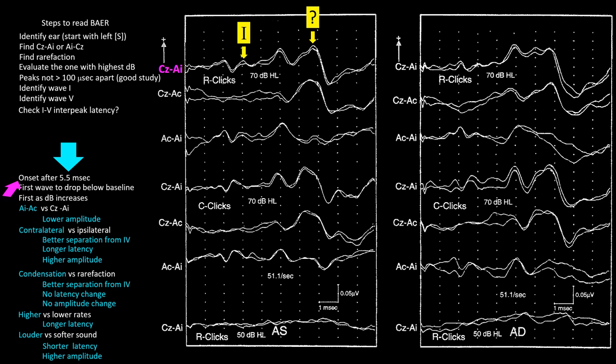The first item is if it is present after 5.5 milliseconds. This is clearly so. So this item is met.